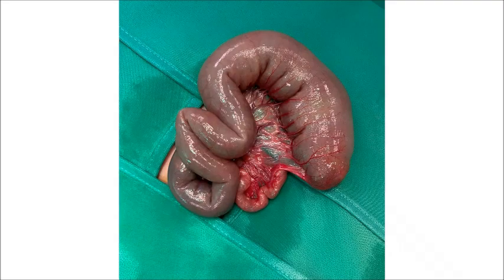Now you can see the postoperative findings. The surgery went well. There were no complications and our diagnosis was confirmed. It is always important for you to collaborate with the pediatric surgeon, both before and after.